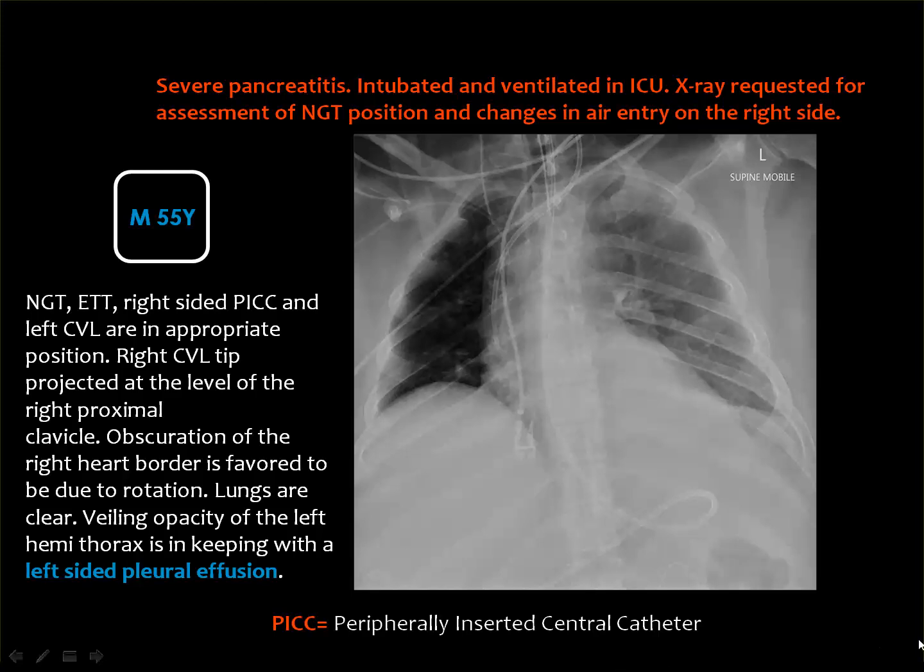And this is a chest X-ray in a patient with severe pancreatitis, intubated and ventilated in the ICU. The chest X-ray was requested for assessment of the nasogastric tube position and the changes of air entry on the right side.